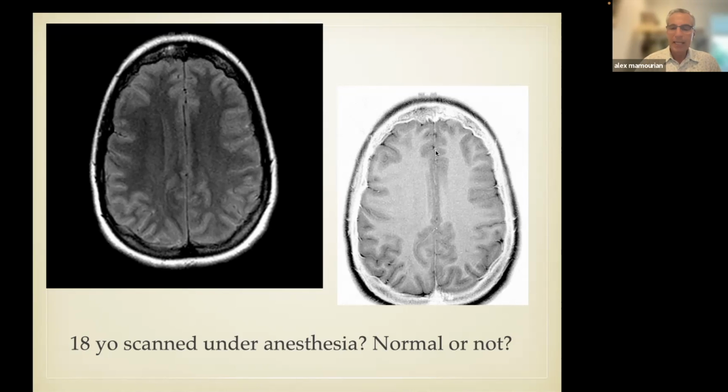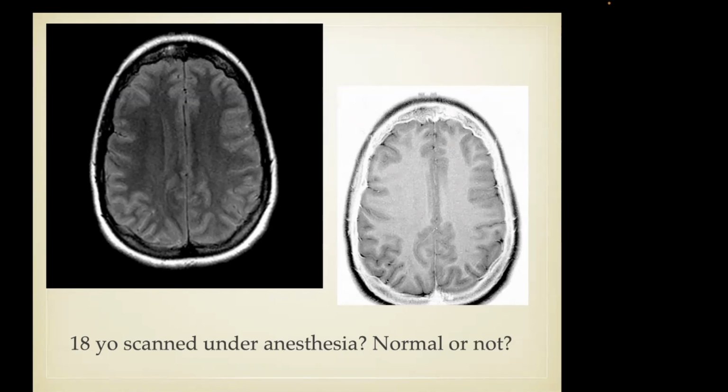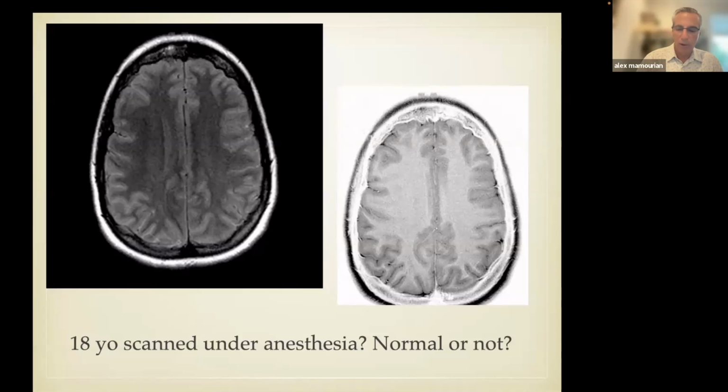By reversing the T2 weighted scan, you can see where the sulci are. That allows me to say the reason I don't see any sulcus here is because the CSF is abnormal, whereas over here, the reason I don't see any CSF is because the sulci are effaced by the volume of the brain. So use that technique when you have a question about whether you're looking at just a large brain volume or at effacement of the subarachnoid space.